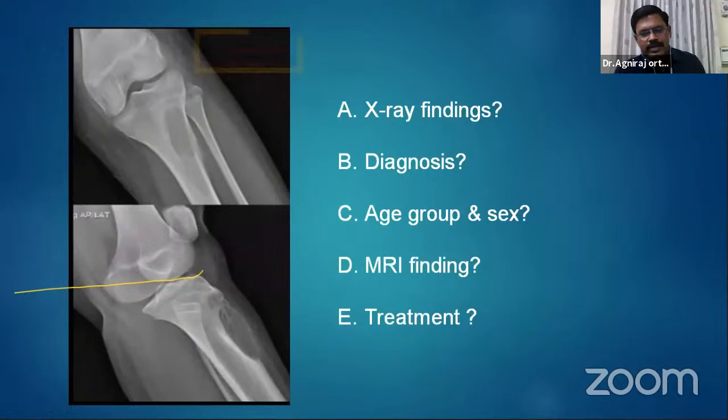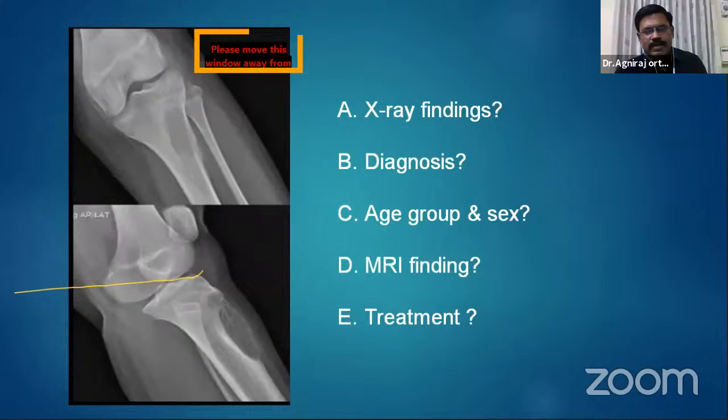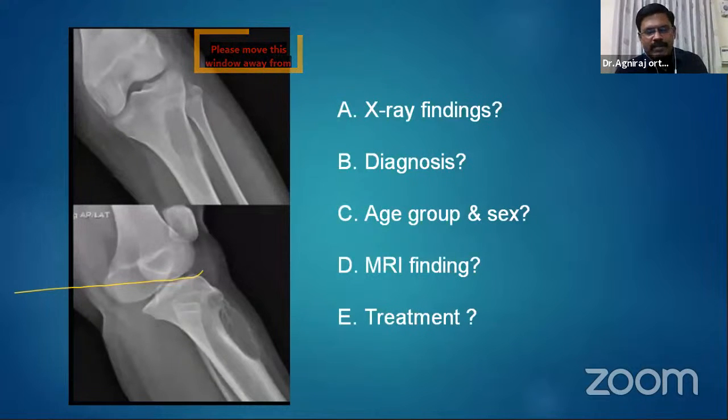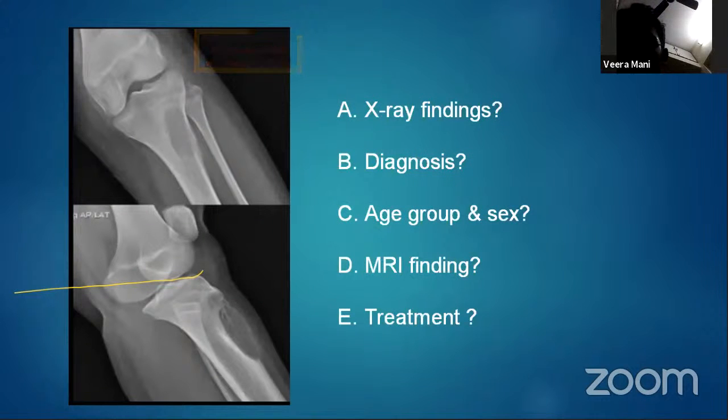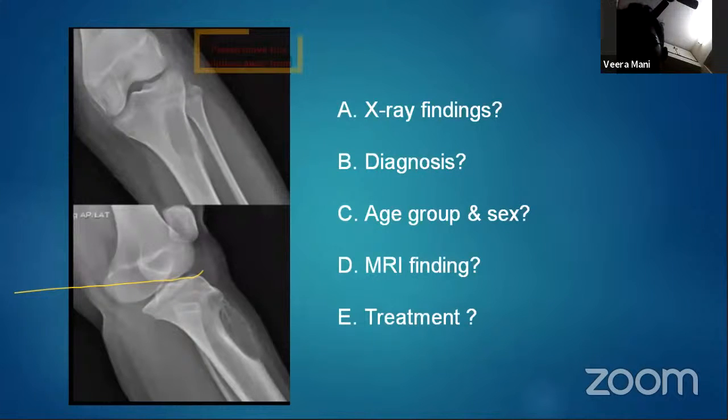I don't want you to say the age group; that you have to find out. Okay. So first point, age is skeletally immature. Location, what do you want to comment? Sir, metaphyseal. Metaphysis of the proximal tibia. Okay. Border? Sir, well-defined border. Pattern of bone destruction? Sir, lytic lesions. In lytic lesion, what is the pattern? There are three types. Geographic pattern, sir.